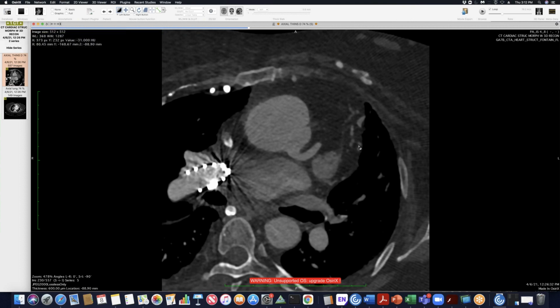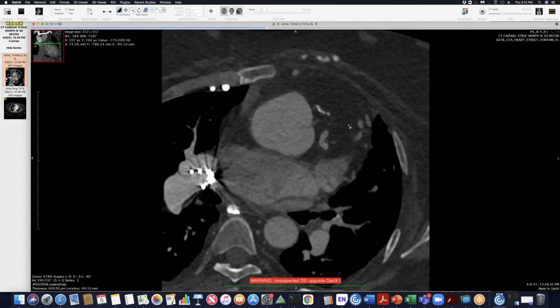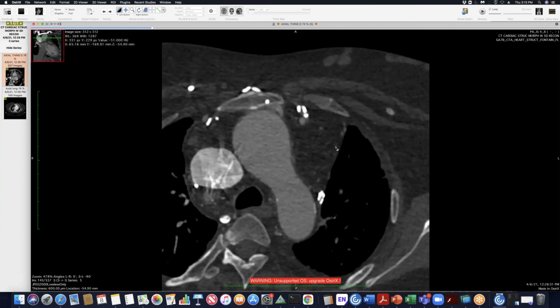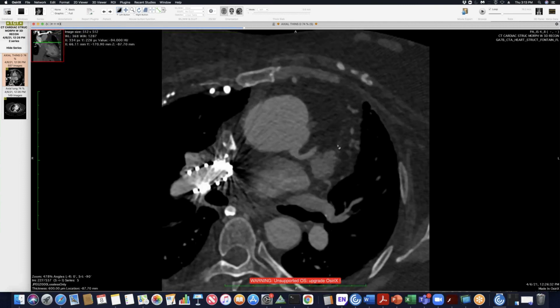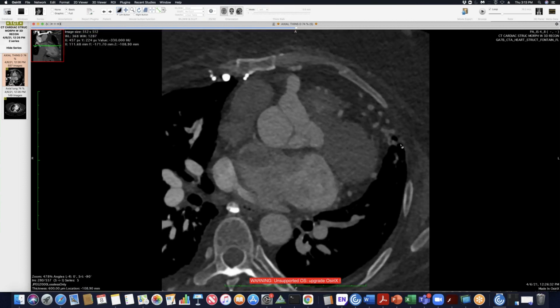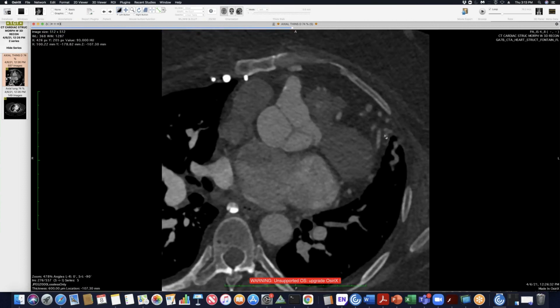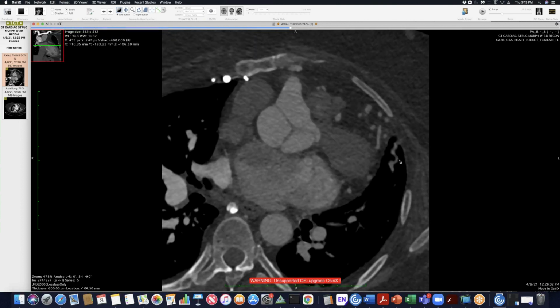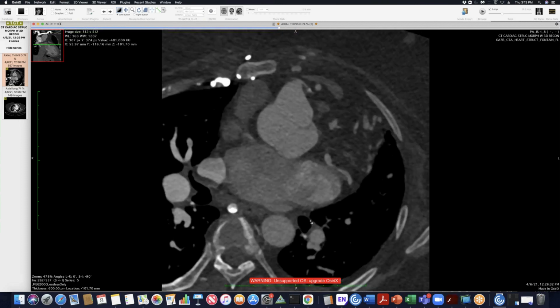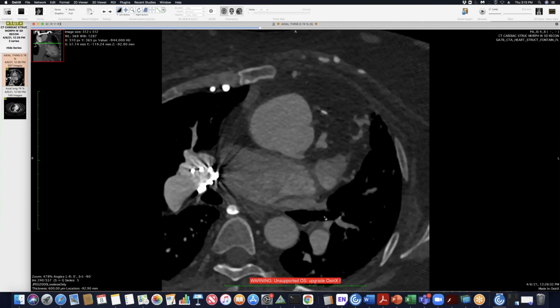And then also over time, with the increased systemic venous pressures with the Glenn shunt and pulmonary hypertension, she develops a lot of venous collaterals in the chest wall. Some of them are already coiled here, and it's a good example of transpleural collateralization from the mediastinum or chest wall into the venous collaterals into the pulmonary circulation, and that eventually dumps into the lower pressures of the left atrium.